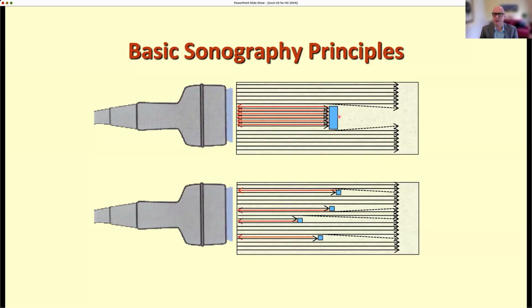Things that are solid, for example, metal, will reflect ultrasounds completely. You see, for example, here's a solid obstacle to the diffusion of ultrasounds in tissue, and you can see that all of the ultrasounds are reflected back. The machine will read this as an extreme intensity of signal, and in the map of colors that you can see in the grayscale, this will be very bright white. Everything that receives a lot of ultrasounds is white on the images that are generated. So you'll see a very bright signal.